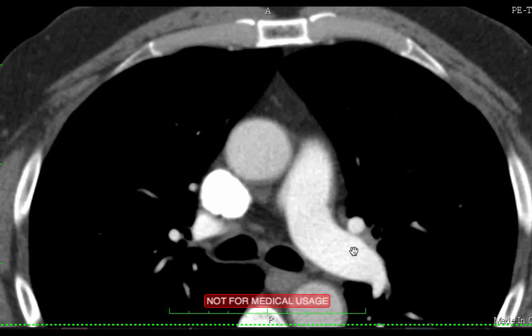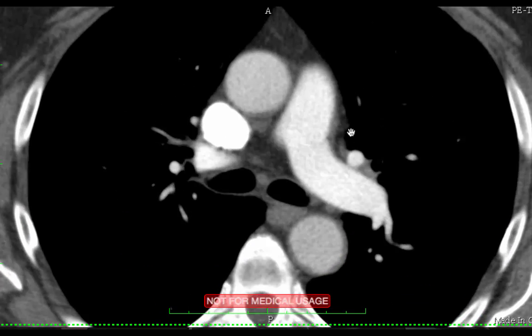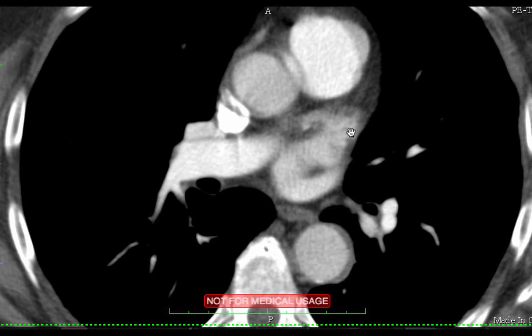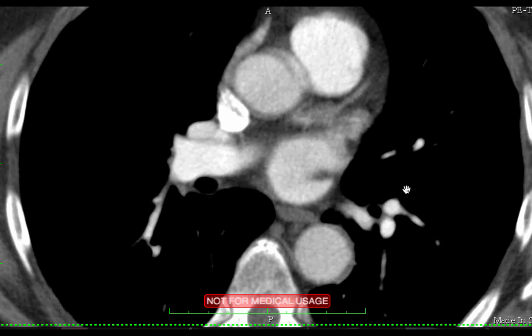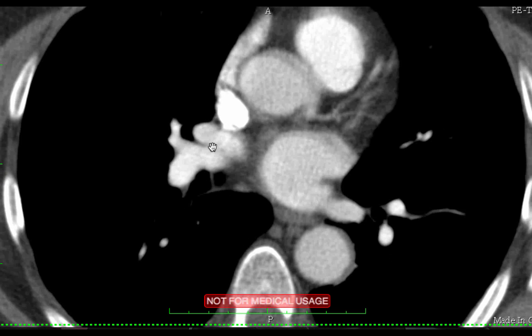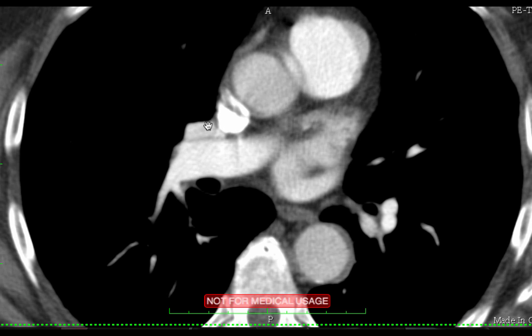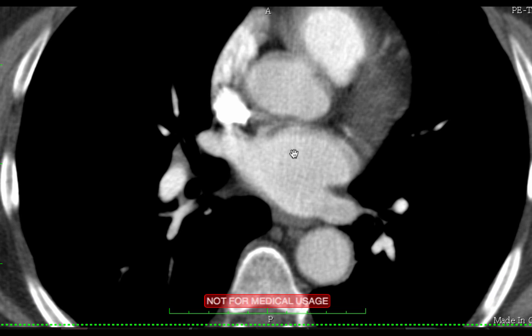And then, once the reoxygenation has taken place, let's look. You see that the pulmonary veins come down here, and here's one coming from the right lung, pulmonary vein right next to a pulmonary artery, pulmonary vein coming into the left atrium.